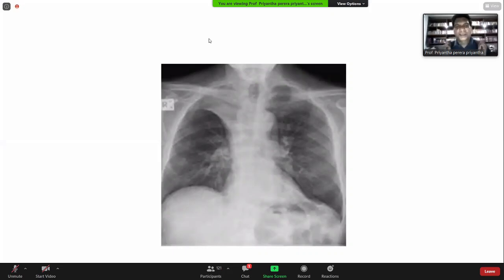So this is a chest X-ray of an infant who developed coughing while feeding. Milk aspiration. Right. Leading to what? Aspiration pneumonia due to milk aspiration. Which part of the lung is involved? Apical areas, the right side apical. Yes, right apex. So this is actually a collapse. Right upper lobe collapse.